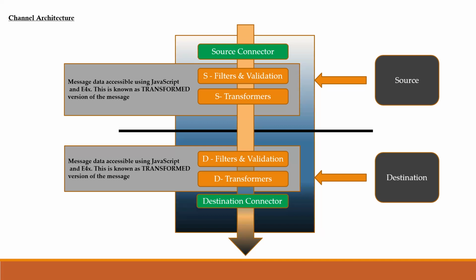Number one is select commands. Number two is update commands. Number three is joins. So please go ahead and review these three topics before we get to a point where we start using SQL. Okay, so let's come back to this section. In source filters and transformers, you will be using JavaScript, E4X, and XML, and that will help us transform the data and apply all the kinds of transformations that you want to.